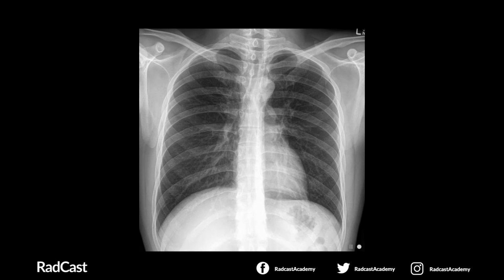Now that you know how to assess the airway and mediastinum, let's use the example of our normal chest X-ray here to look through some of the components. Firstly, assessing the trachea and commenting on its position. Is it central or is it deviated? Here, it's nice and central, and we're not worried about any deviations. Here, we can look at the carina and the right and left main stem bronchi. In this region, we can also evaluate for any paratracheal masses, which we do not see here.